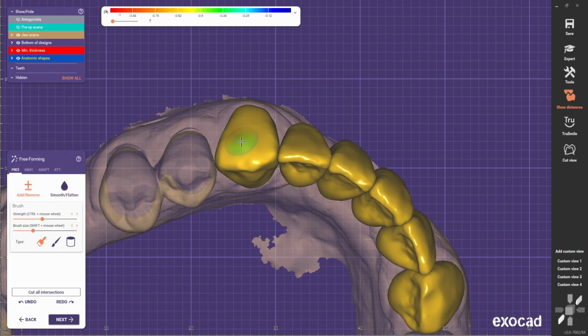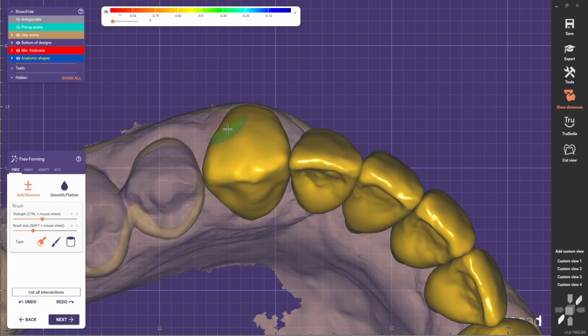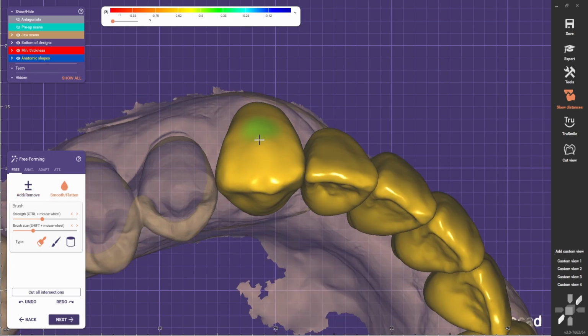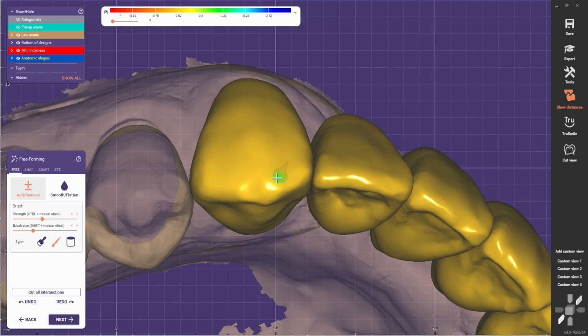As you can see, this library takes a lot of work to make them look natural. That's why usually I avoid using it.